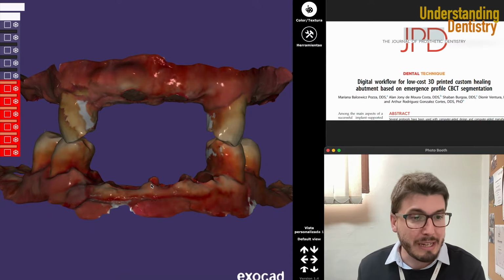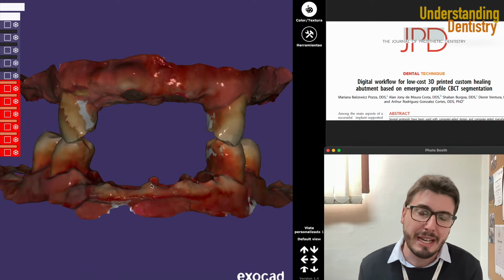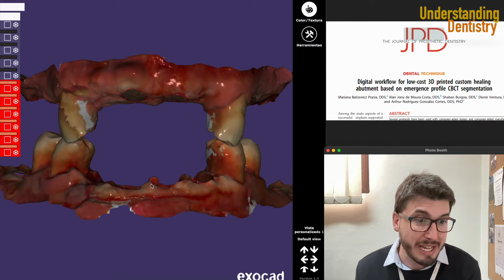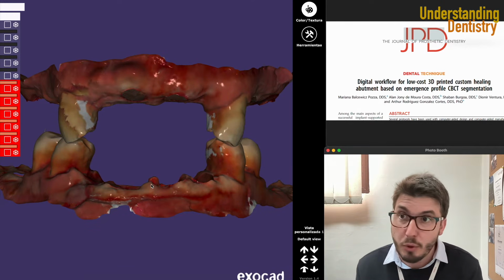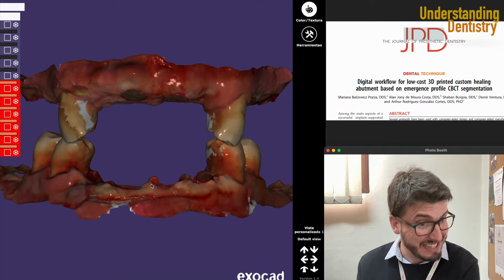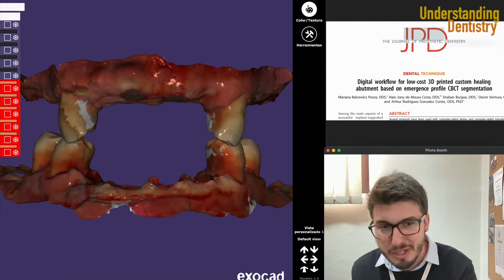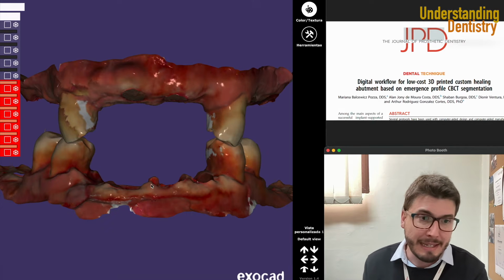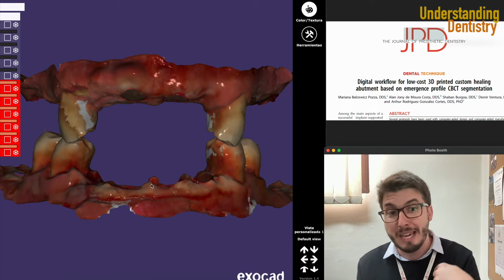You need to take a conventional impression to digitalize, or the intraoral scans like these ones that you are seeing here. And then, if you don't have time, you would send this to a very nice planning center like Beyond Digital Solutions, the BDS one, which is the one that I sent. They would design everything for you, even plan the dental implants, which you can correct because the case belongs to you.